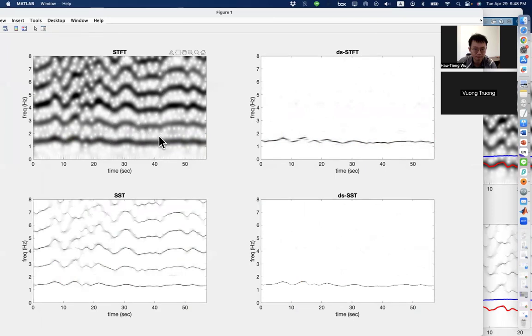Because the signal oscillates non-sinusoidally, it's expected to get harmonics, and there is a fast varying instantaneous frequency. So when your frequency increases, the instantaneous frequency changes fast, so that you get spectral interference. We have discussed all these kinds of things before, so we know what's going on. Synchrosqueezing certainly cannot help in this case. You still get a lot of junk.